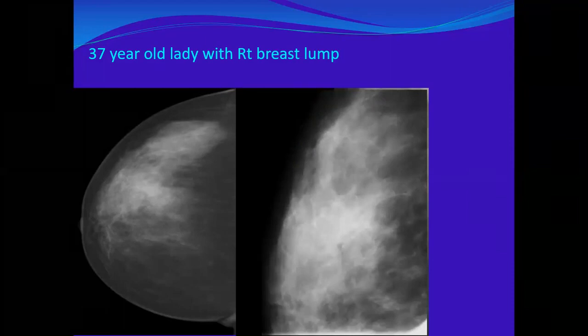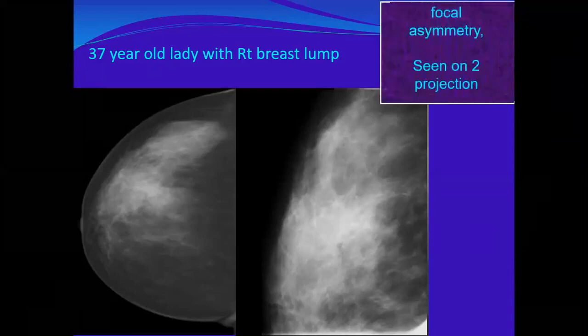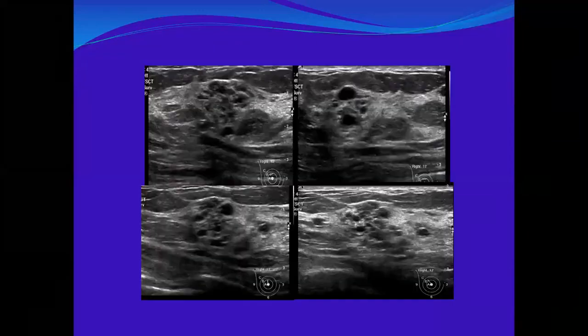So it persists. It's a real focal asymmetry. So I will do targeting ultrasound. It is a real focal asymmetry, so I'll go for ultrasound. This is the ultrasound.